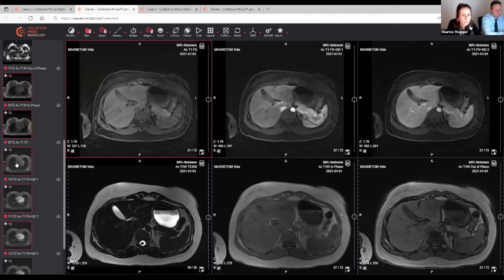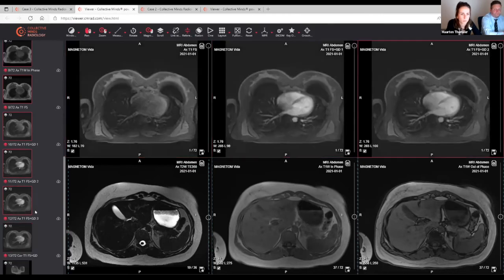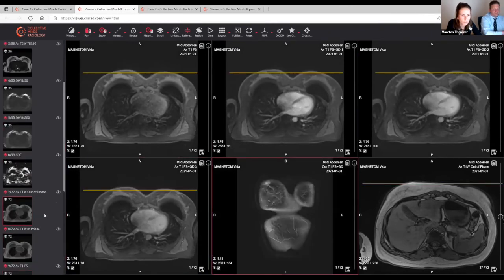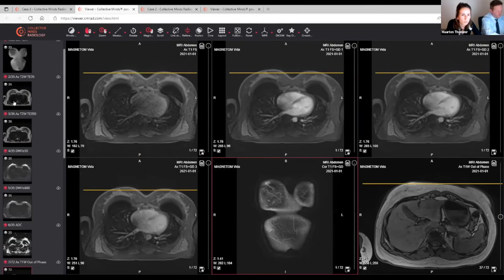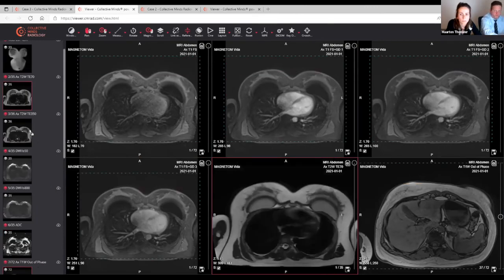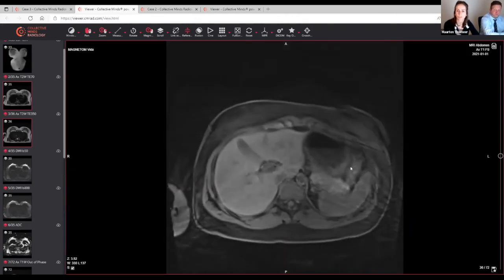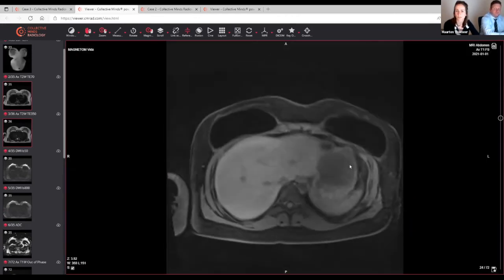Okay, so I will get to the lesion first. This is an arterial phase. The dynamic series I will put up first, coronal maybe, and then T2. Yes, there are two. Okay, so first, T1 weighted images before contrast enhancement.